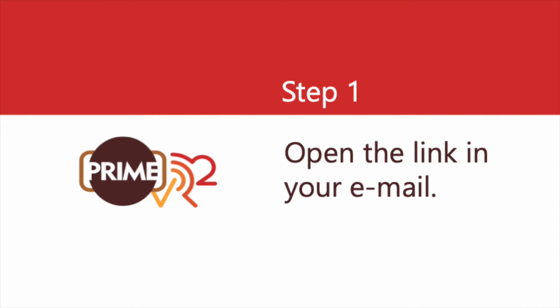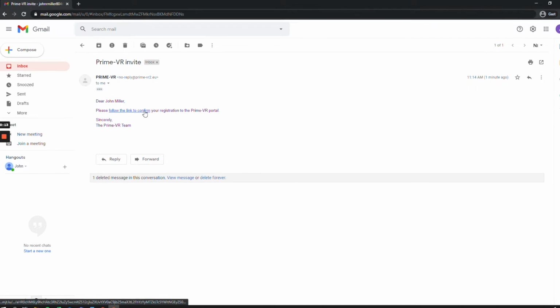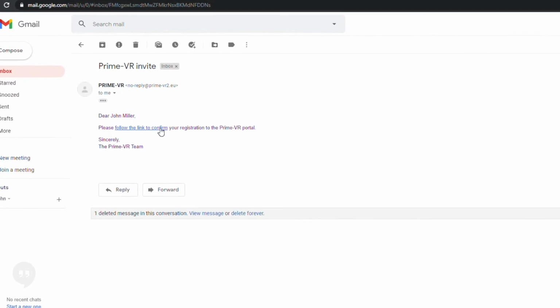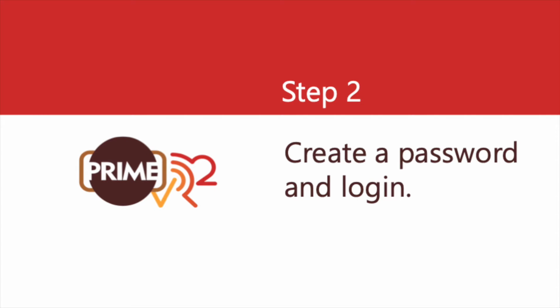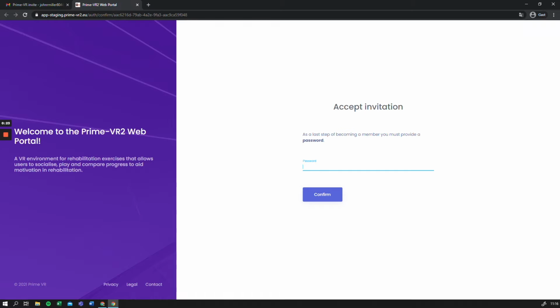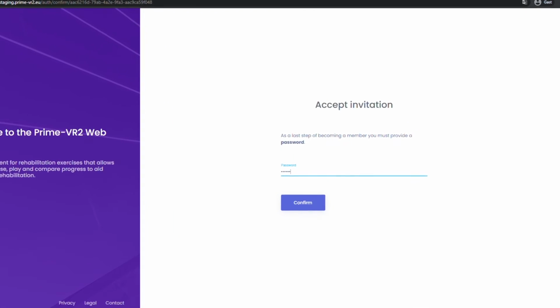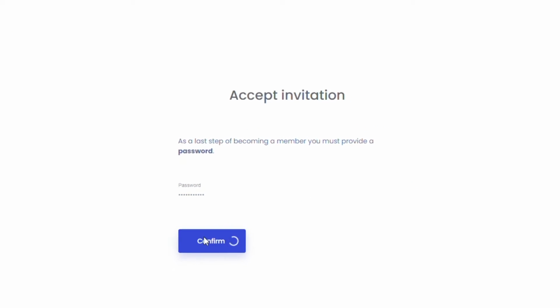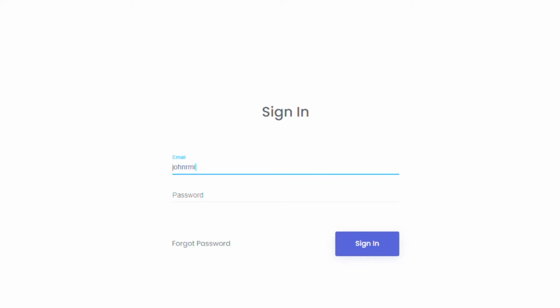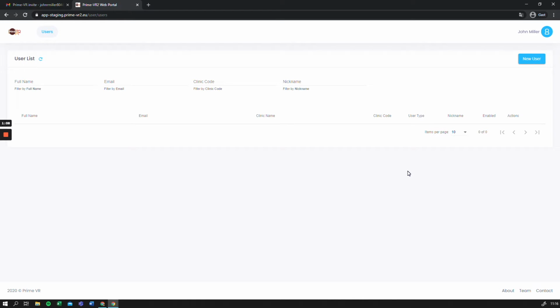You have received an email invitation. In this email, you will find a link. Click on this link to confirm your registration. Accept your invitation by providing a password. Click on Confirm. Sign in to the digital platform by using your email and password. Click on Sign In. Welcome to the therapist's dashboard.